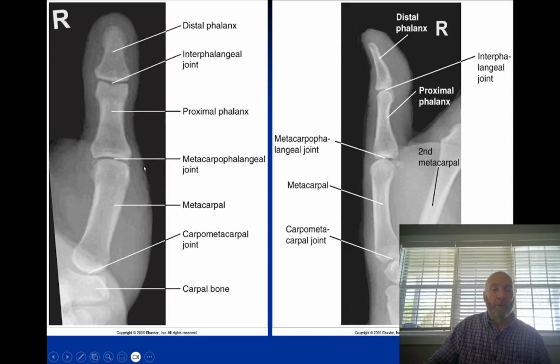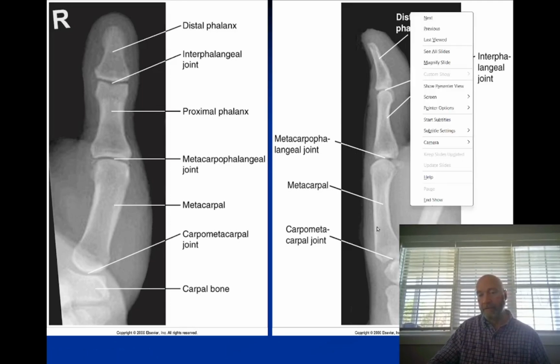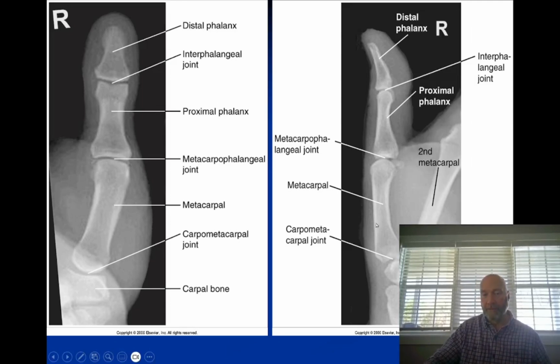It would be important, if you were to try to do that, to shield one side: in other words, make your exposure on one thumb, shield the rest of the cassette, and then move your shield to the opposite side and make your second exposure on the opposite portion of that cassette. So you could put two on one.